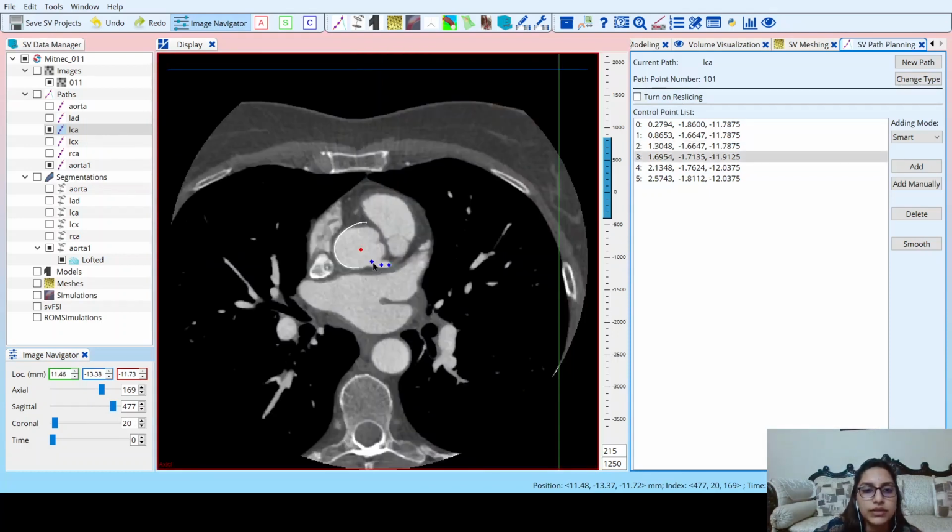Alright, okay, so you don't know which artery is going to be the right or the left one, but I'm going to tell you one trick. You can always check it there in the 3D model, the one in the 3D plane, to see if you have plotted the correct one or not.